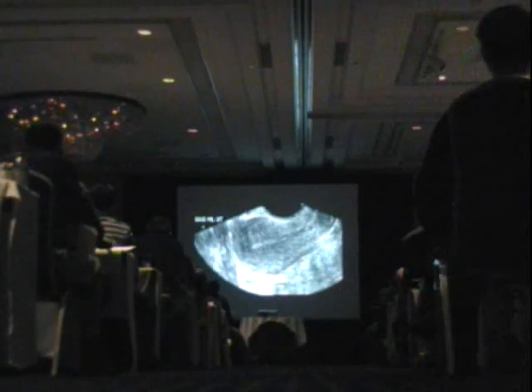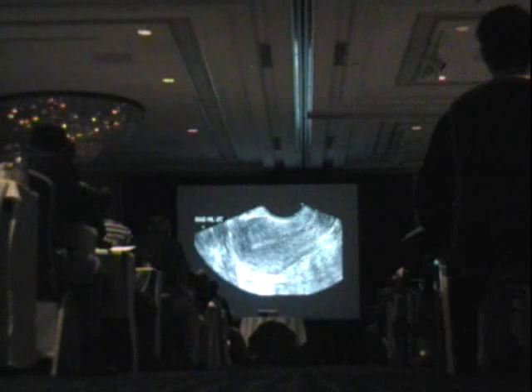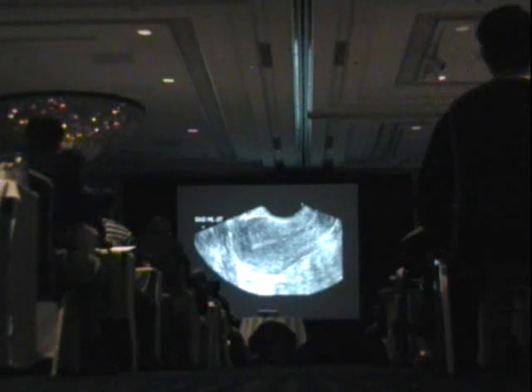Here's a patient who came in status post Mirena IUD placement, and honestly, I know that Mirena IUDs are hard to find, and I hadn't seen very many of them yet, and I'm scanning and scanning and looking back and forth and thinking to myself, I know they're hard to find, but I don't think it's in there. And everyone's like, no, they're really hard to find. It's probably there. I said, I don't think it's in there. I can't find it. And indeed, when we sent her off for a plain film, here it is up here.